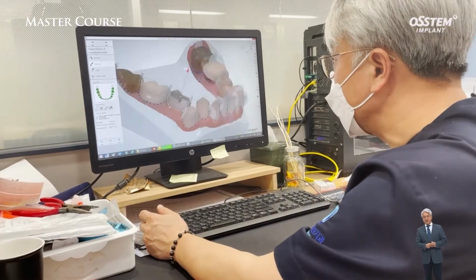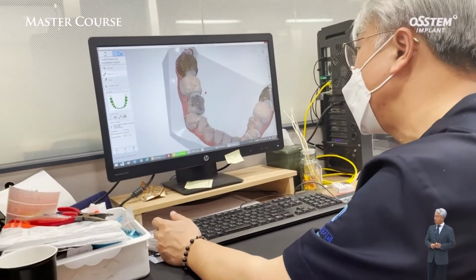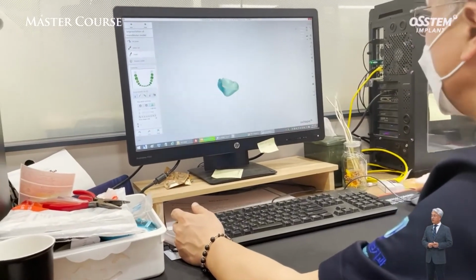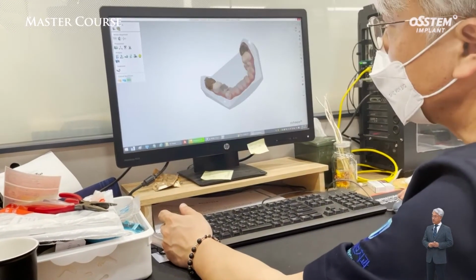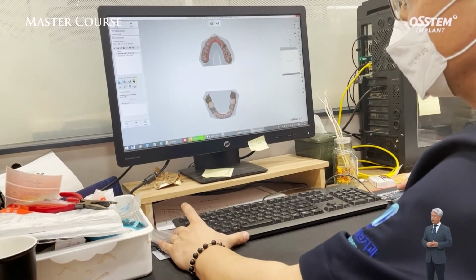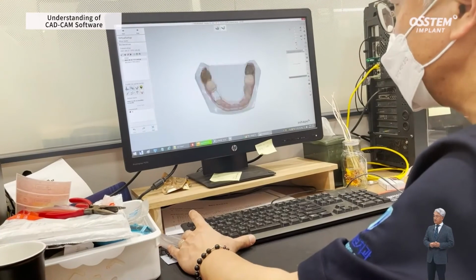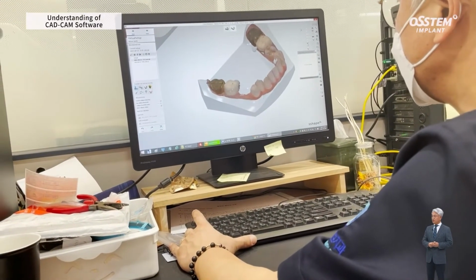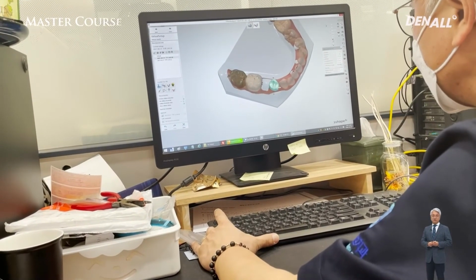This is how the orthodontic setup is done at my private clinic. This deciduous tooth is extracted. As shown, number 44 needs to be aligned, and after that, in the empty space, implant treatment will be done. Before implant placement, I'm simulating orthodontic treatment. Let me show you the video.